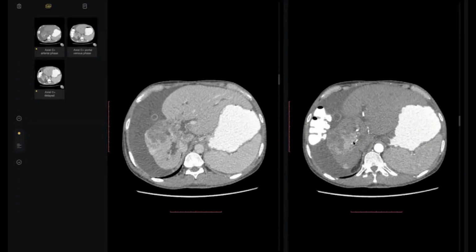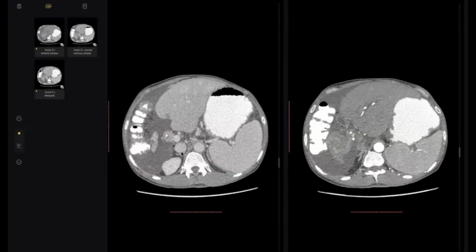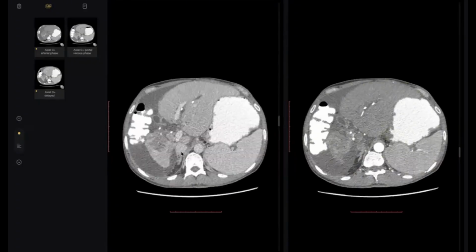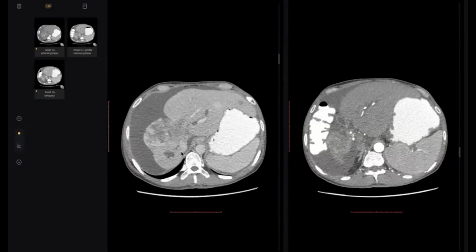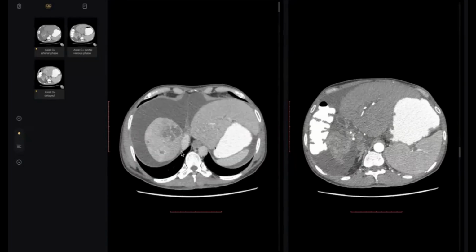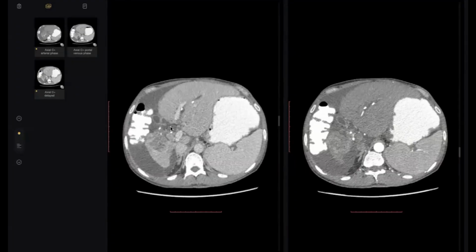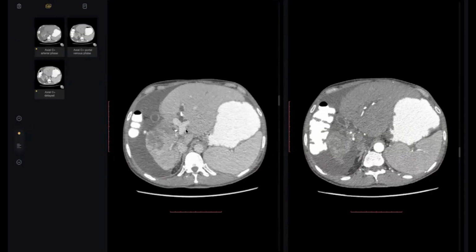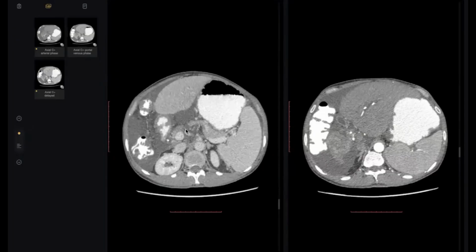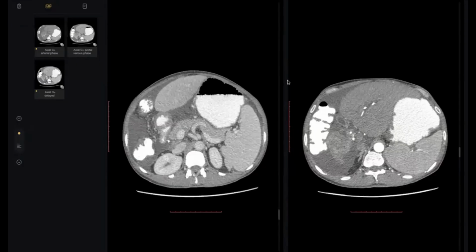You picked up the findings, but you forgot to tell me. I wanted to check the portal vein to rule out tumoral thrombosis. And the ascites is hypodense. And what about this one? Biliary stent. Okay. Thank you, my colleagues.